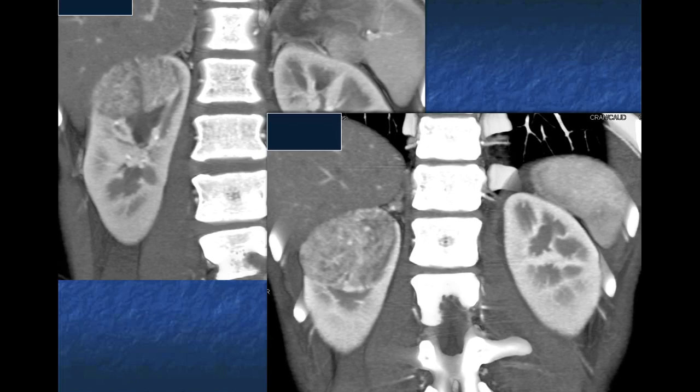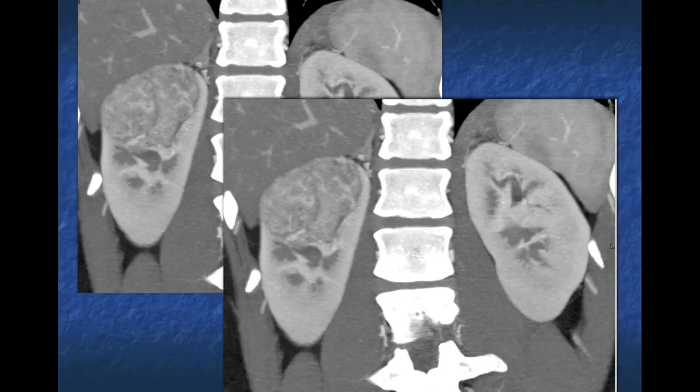What else could this be? Could it be a chromophobe adenoma? I don't know. It doesn't really look like that. It looks like a renal cell carcinoma, and the question would be, papillary versus clear cell. But at 17 years old, we think about younger patients with tumors under 10 or usually under 5. We think about Wilms. We think of nephroblastoma.